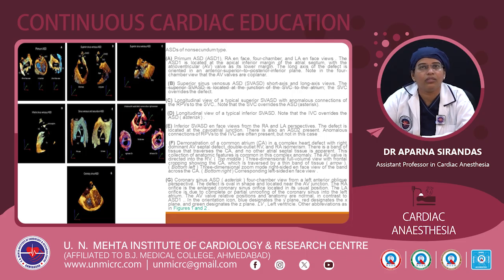And coming to the D figure, it is a longitudinal view of typical inferior sinus venosus ASD. Note that the IVC overrides the ASD.